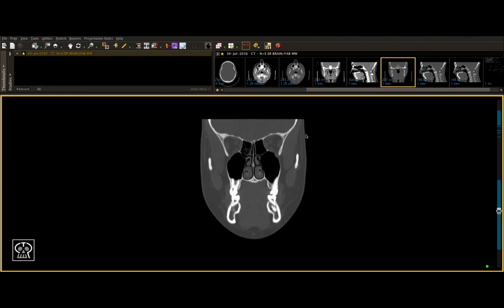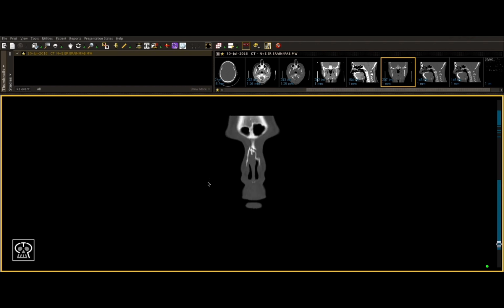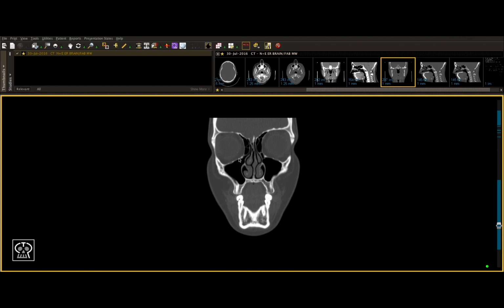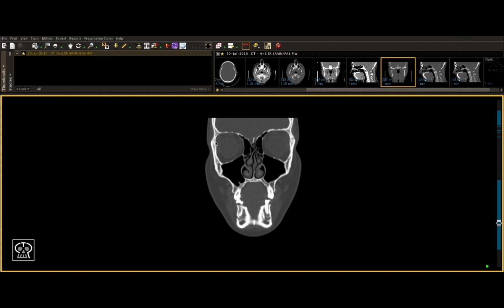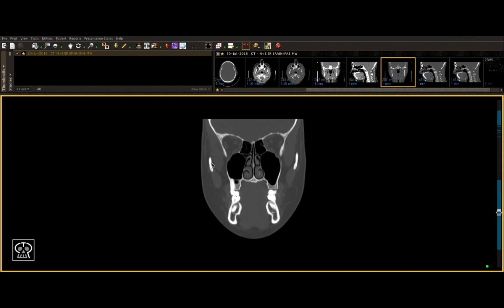As we move on to our coronal view, we've already discussed the 4 suture lines and where they are. But when examining, going from anterior to posterior, you would want to take a look at your inferior orbital rim, your orbital floor, your maxillary sinus walls, your ZF suture, your lateral orbital wall, as well as your connection with the temporal bone in the zygomatic arch.